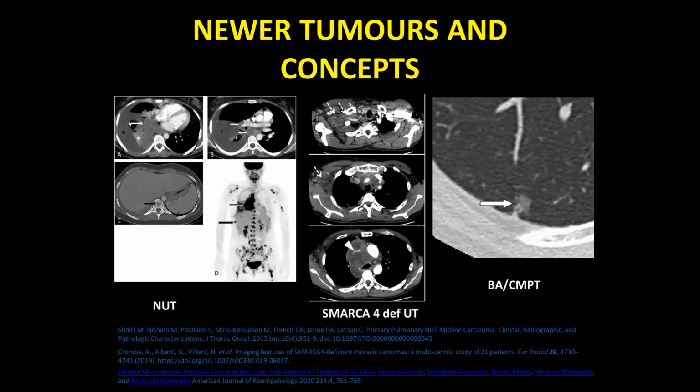The interesting thing about this is that it produces extensive adenopathy, which compresses some of the structures, and a central mass which enhances, with pleural effusion. But the most characteristic thing is that it all occurs on only one side. Usually it does not go to the opposite side at all. Though it is midline, it does not cross to the other side. This is happening in younger patients.